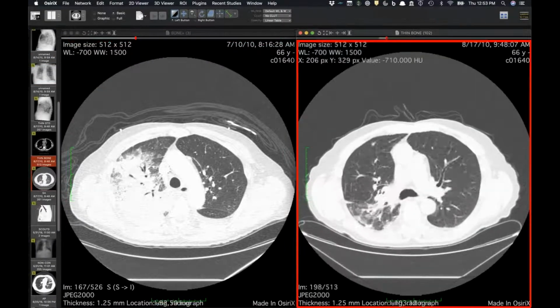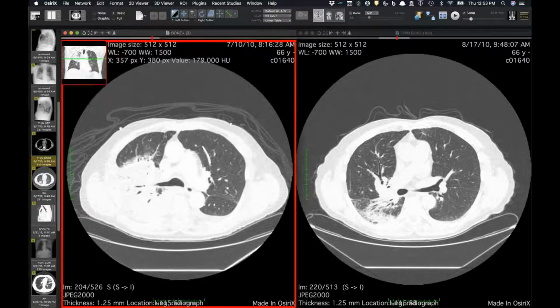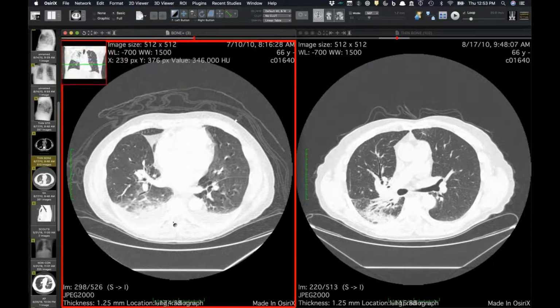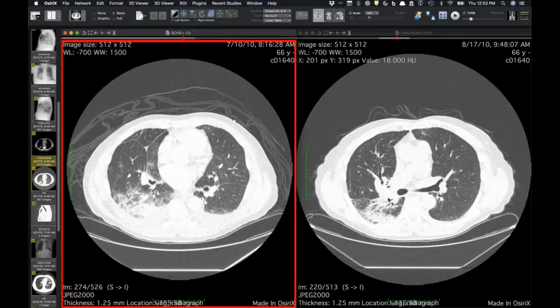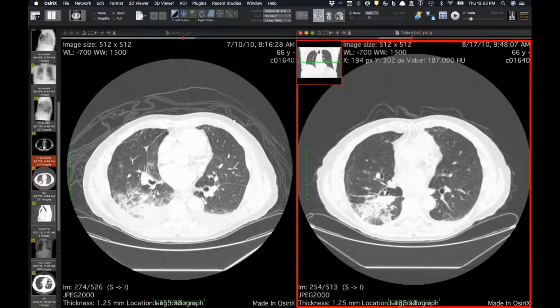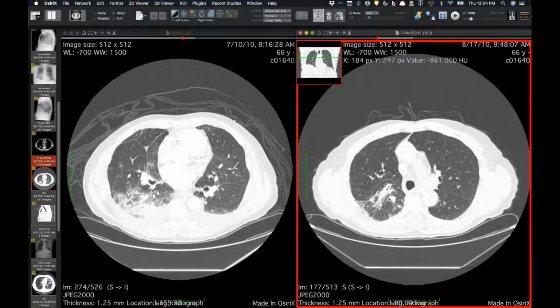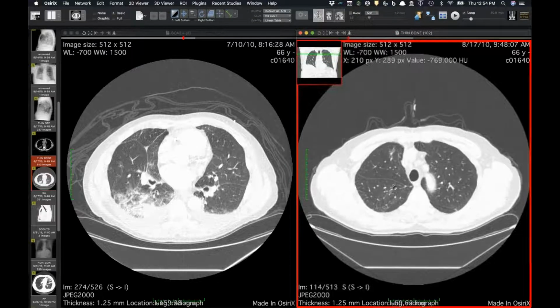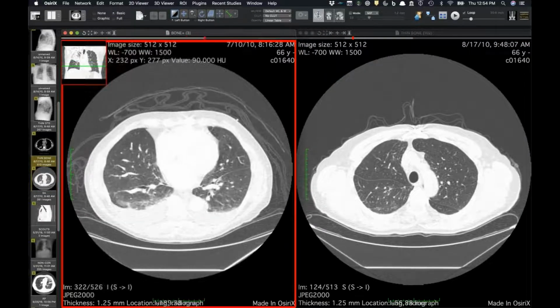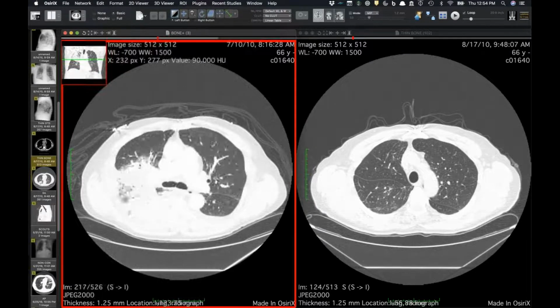Here's his, where you see it in the right upper lobe, and then on the follow-up CT. I don't know if Jeff is still on or if he remembers if they went to detorse this or not. But in this case, it rotated backwards rather than forwards, I think, because the right middle lobe is in here, and it is what is now occupying the apical portions of the right hemithorax. That makes sense. And Travis, the interesting observation is these patients have nearly or totally complete fissures.